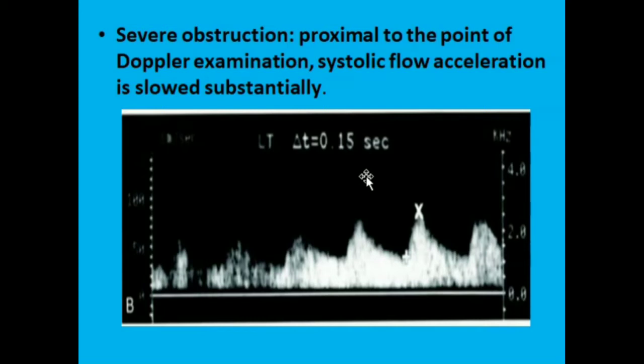So, proximal to the point of the examination, there is some obstruction which is slowing down the acceleration.